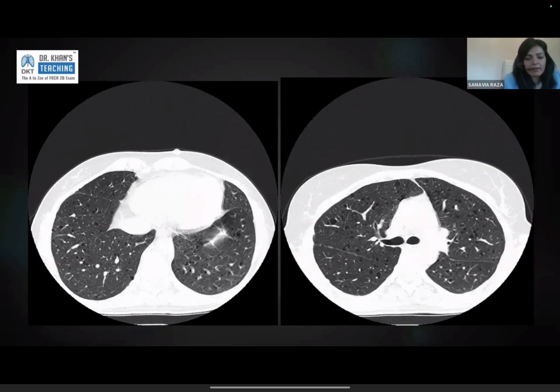and not look back. And that is how these patients go undiagnosed, until it is so advanced and prominent and bilateral, and the underlying lungs happen to be very healthy, that you can see the cyst wall. Do they get picked up?